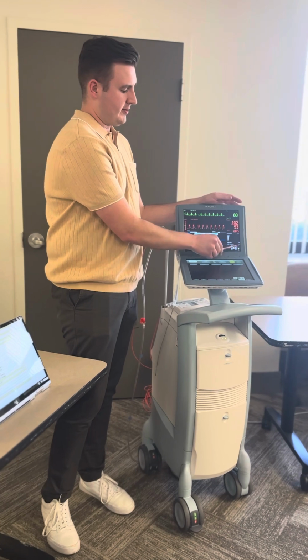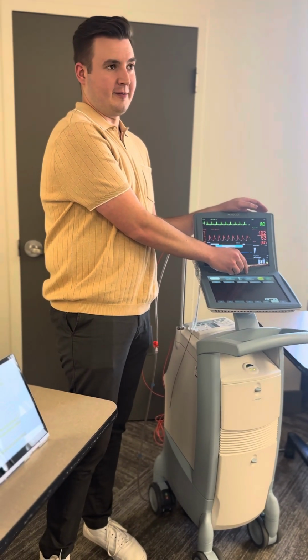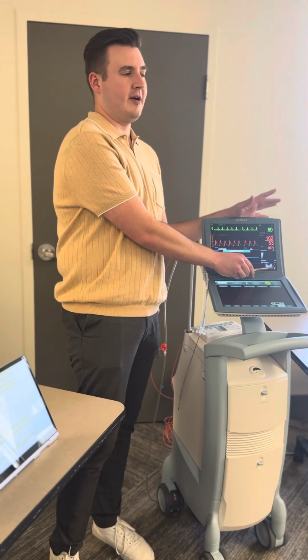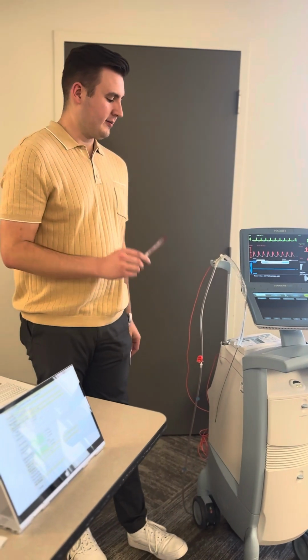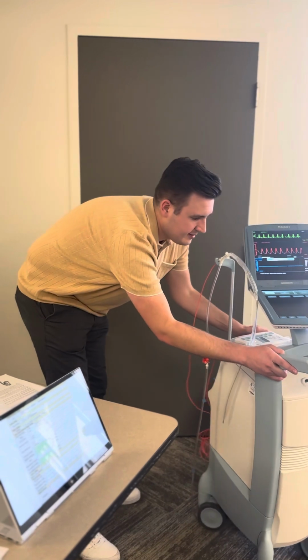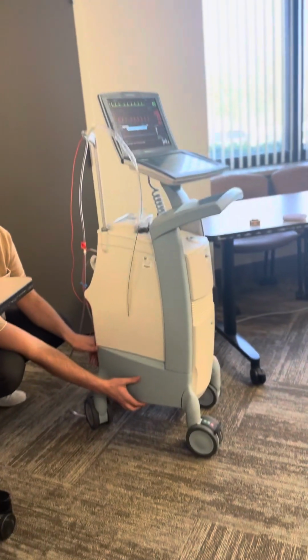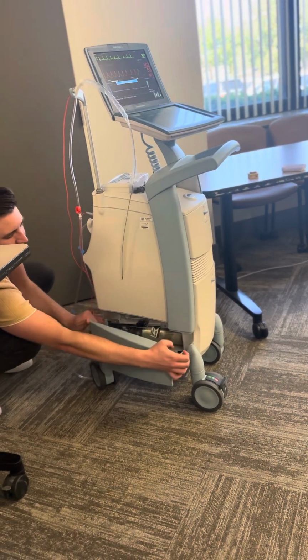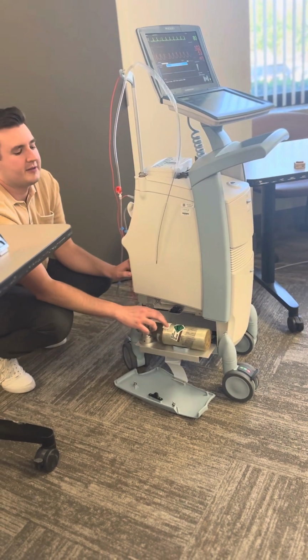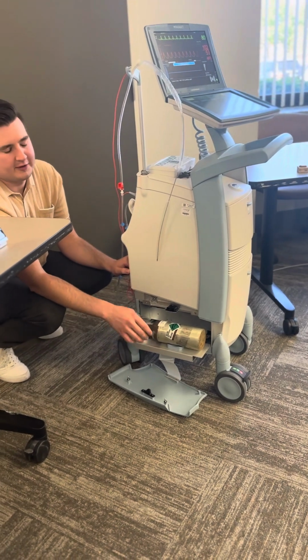To change helium, you can see my helium's halfway full. Even when it drops to red, it's not the end of the world. You need to get it changed, but it's not a time-urgent thing. You have plenty of time to get it changed. Helium tanks are stored in cath lab. Down here on the right, there's a HE helium thing. This pops right off. This drawer slides out, and there are these little tiny helium tanks in cath lab. Then you just hook it up like an oxygen regulator.